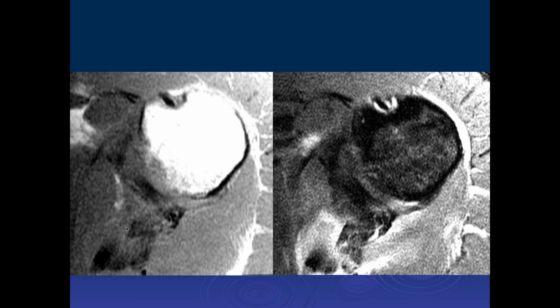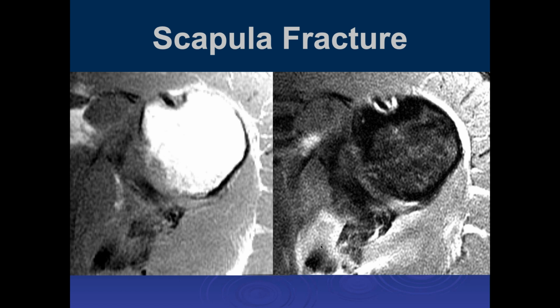All right, so here we can see a comminuted fracture of what we can see of the distal scapula, and I don't see any discrete extension through the glenoid, although posteriorly there may be some intra-articular extension. Do you think it's comminuted? Yes, I do. I see multiple regions of linear fluid signal intensity compatible with multiple fractures.